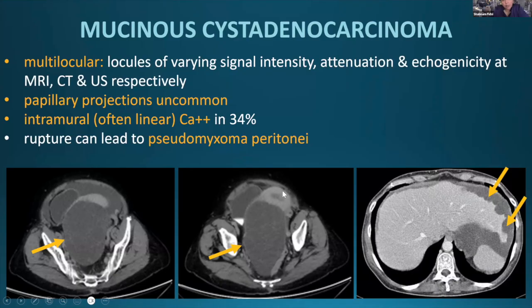Here you can see the uterus deviated anteriorly. The cystic structure within the right hemipelvis is actually the urinary bladder because it fills with contrast on delayed imaging. And within the posterior cul-de-sac, you see this large complex multiloculated mass. Perhaps you can appreciate its multiloculated nature and multiple thin septations on CT.